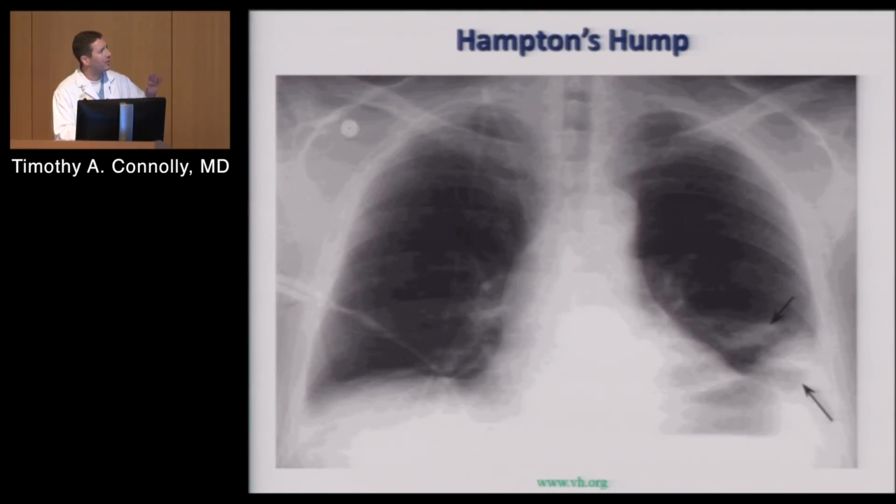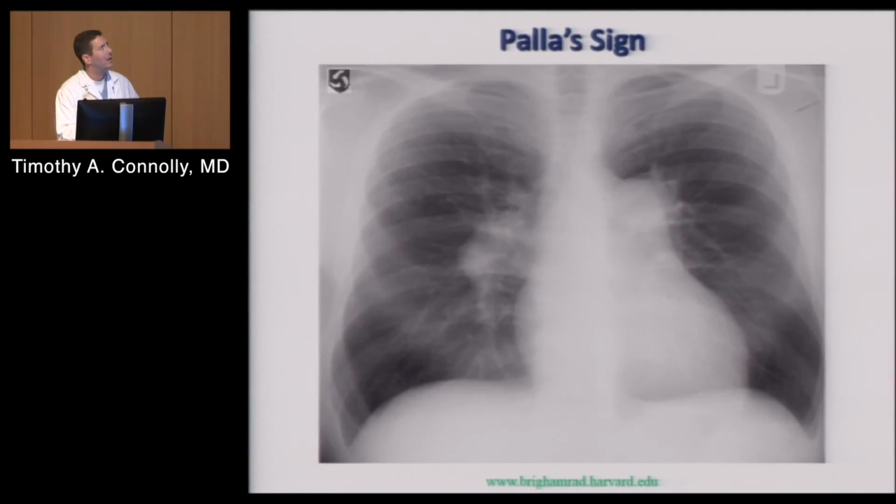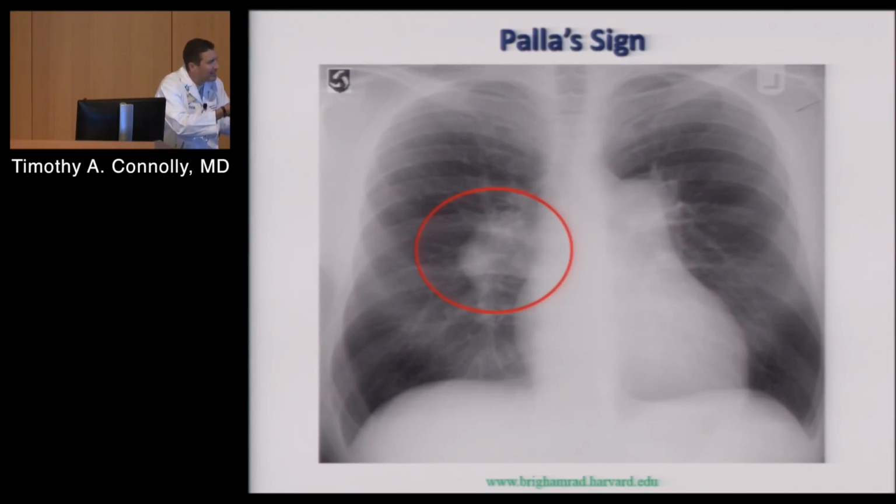So these are things that are on your handout that may occasionally be asked on an exam. The reality is the most common finding for patients with PE on radiograph is atelectasis. Not normal, atelectasis. That's the most common. And it's usually just going to be some subtle little bit of atelectasis right here that, again, wouldn't tip you off clinically in and of itself.